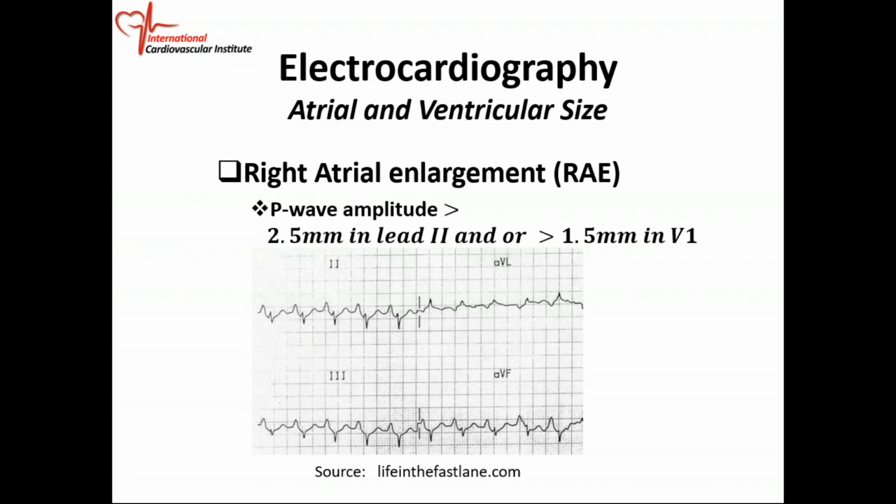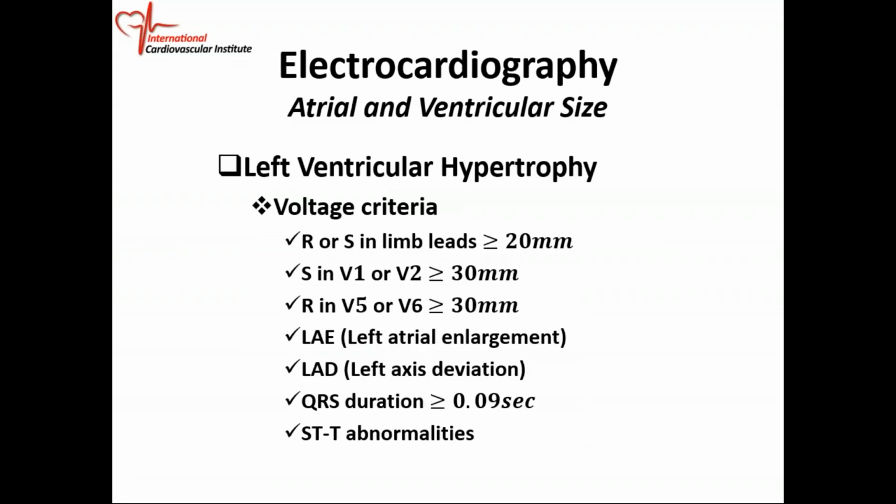Okay, so we looked at left atrial enlargement, we looked at right atrial enlargement. Let's look at left ventricular hypertrophy. We see a lot of EKGs coming in, patients coming in for ECG, because of left ventricular hypertrophy.